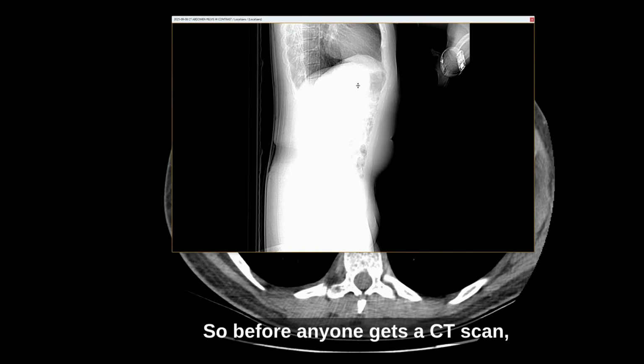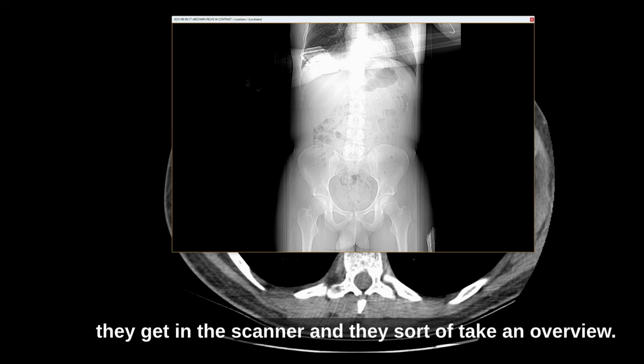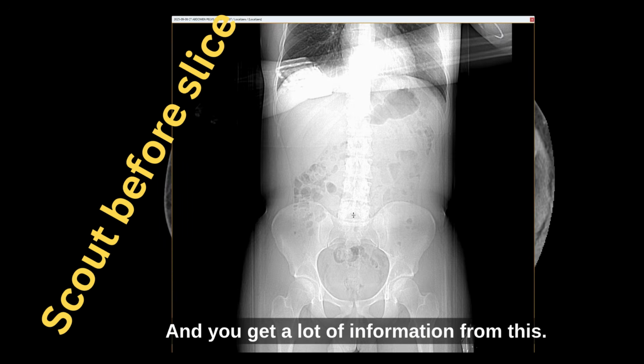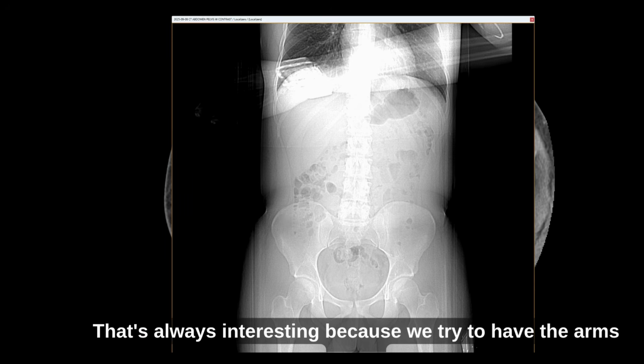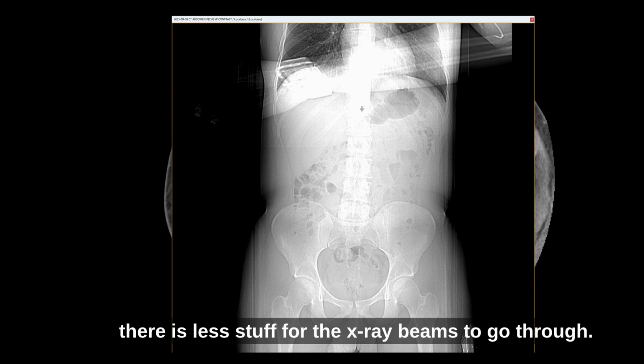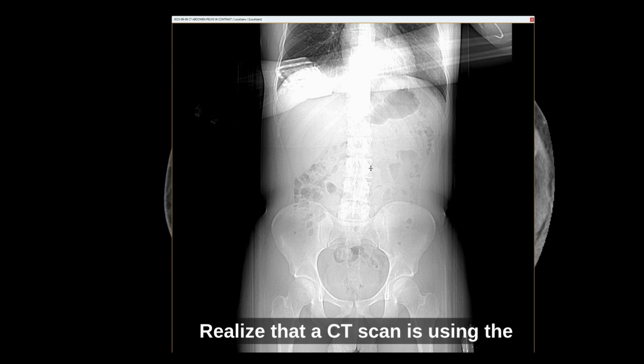Before anyone gets a CT scan, they get in the scanner and the scanner takes an overview, and you get a lot of information from this. The first thing I see is one arm is down. That's always interesting because we try to have the arms up so there is less stuff for the x-ray beams to go through. Realize that a CT scan uses the same x-rays as a regular radiograph. That is not necessarily intuitive to everyone.